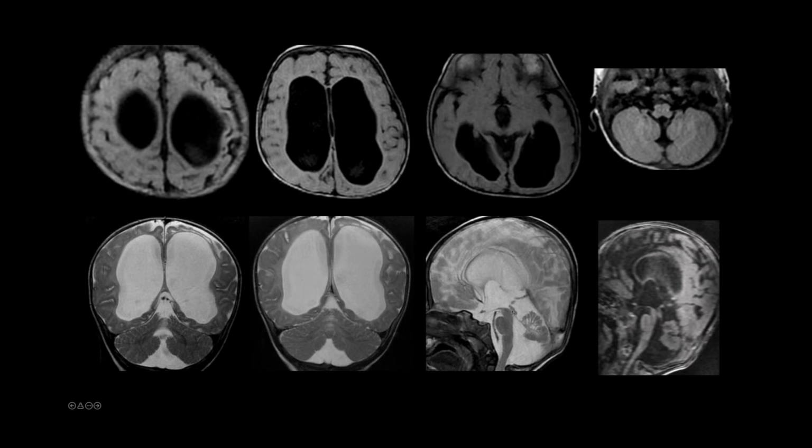In the aqueduct, these are not dedicated images, but I can appreciate some areas of stenosis in the mid-aqueductal region. The corpus callosum is demonstrating secondary changes of the ventriculomegaly. I cannot appreciate any cortical malformations. Again, in the coronal images, you can appreciate the gliotic or encephalomalacic changes of the cortex, but no cortical malformations and no cerebellar cysts. There is generalized hypoplasia of the cerebellum and some degree of atrophy in the vermis.